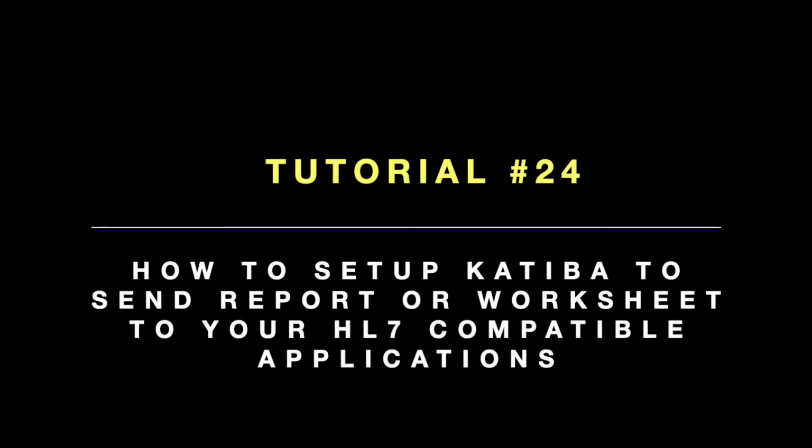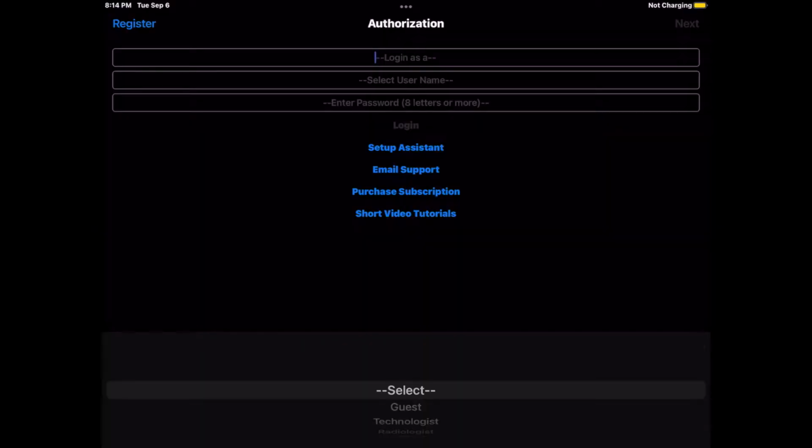How to set up your device to send report or worksheet data to your third-party HL7 compatible applications. You need to log in as an admin IT user to make changes to your network settings. If you don't have an admin IT account, watch the tutorial on how to register a new admin IT user.